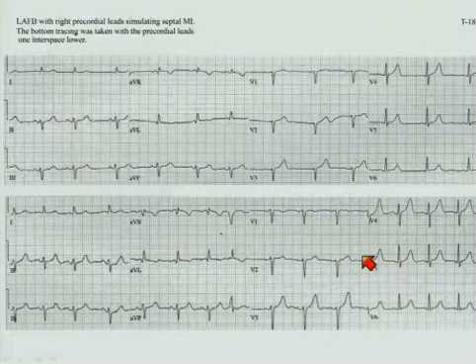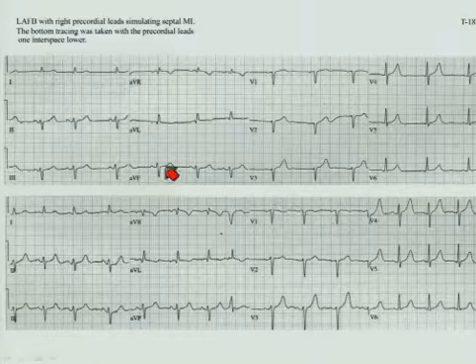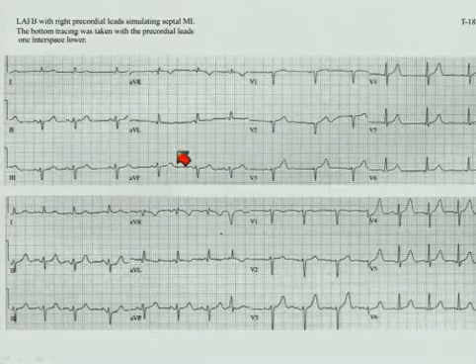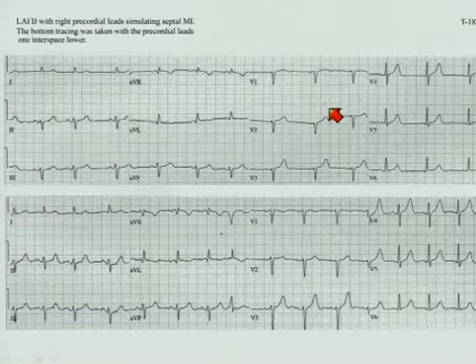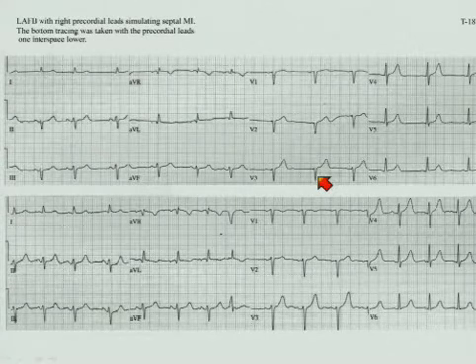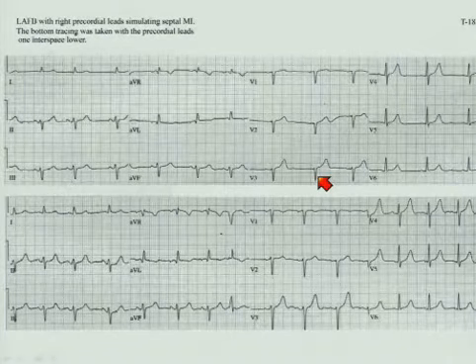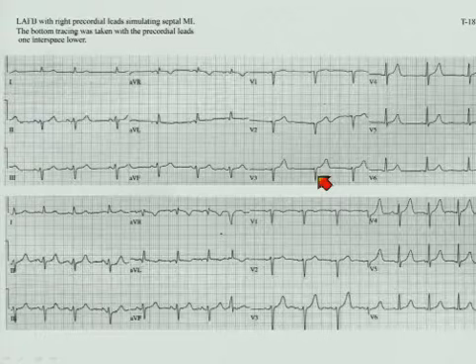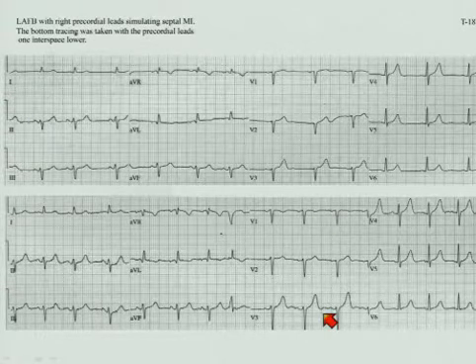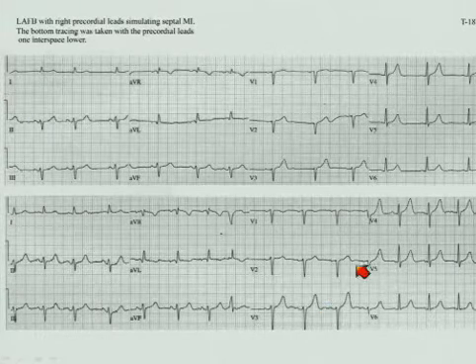First of all, let me show you just a standard left anterior fascicular block: the axis to the left, small Q wave in aVL. You'll notice here there is poor R wave progression. That can be part and parcel of the left anterior fascicular block as well. And sometimes putting the electrode one interspace down will allow those R waves to be more evident.